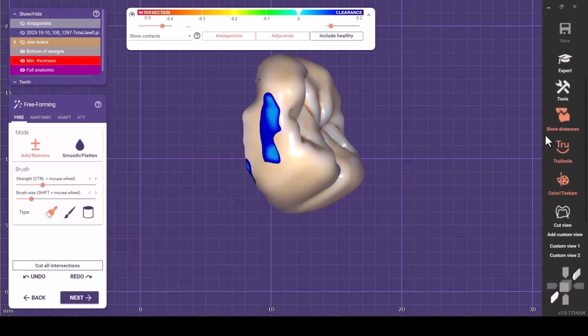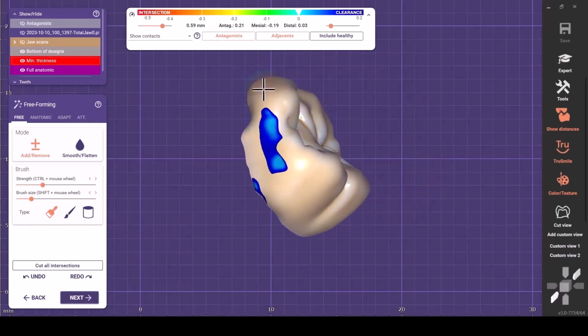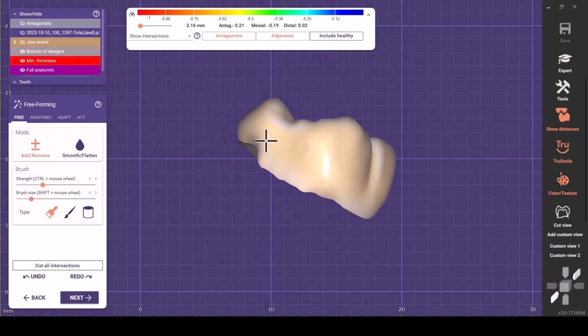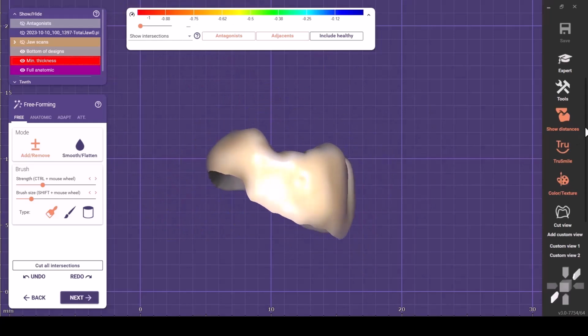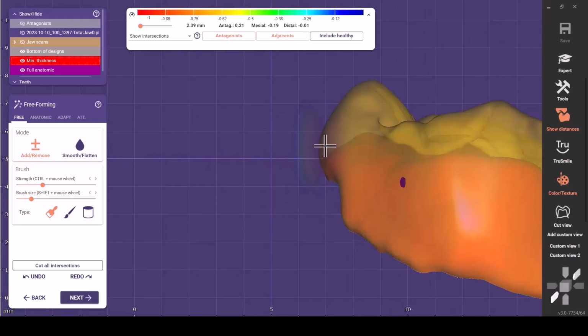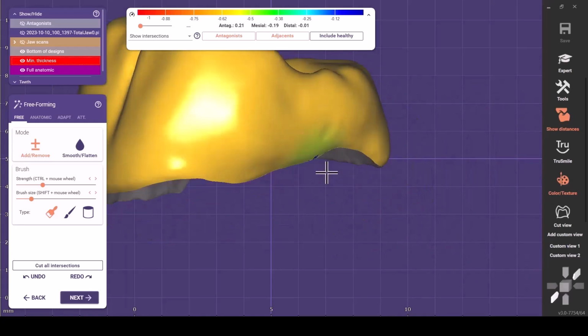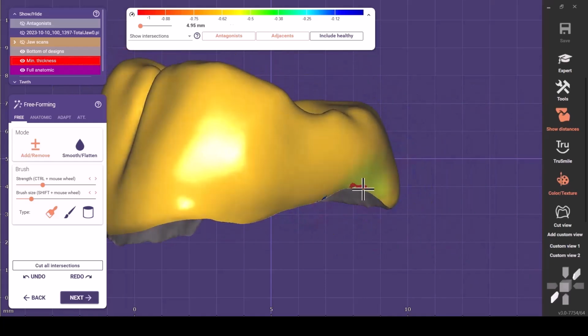So it's going to block the undercuts, and then I'm going back to smooth this area and see my intersection. There is no intersection. Now I should add a little bit of intersection. And remember to make your contact area wide. I've seen some bulge here, so I would like to refine it. Checking the other side of the contact. Now adding some intersection.